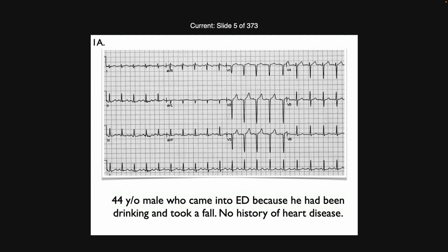Old infarct. What kind of an infarct? Posterior. No. Sorry. Wake up. Yeah, septal anterior, okay. And, no, it's okay, it's first minute. Okay, but he has no history of heart disease.